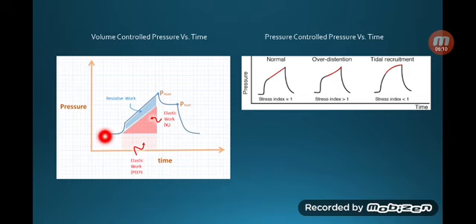So the breath goes in against resistance because the lung is still deflated, or not in the best status. Think about your first breath with a balloon, how deep you need to push, or how strong your breath should be to open up the balloon initially, because you're breathing against resistance, but then it becomes easier. With the first push against the lung, because the pressure is not the target, the volume is the target, the ventilator will overshoot because it's fighting against resistance.